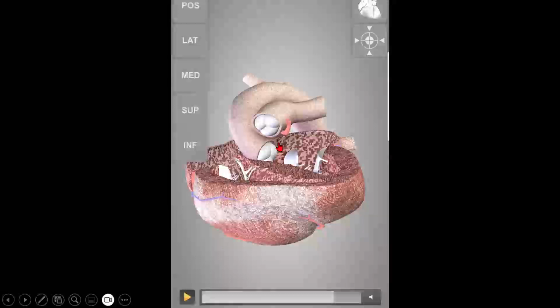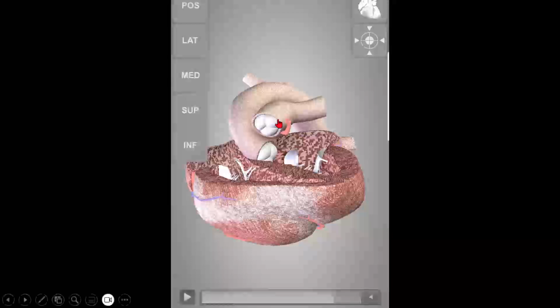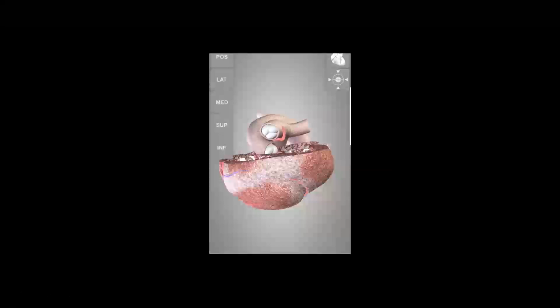So in an apical window, you have the apical 4 chamber view, and the apical 5 chamber view if you sweep the probe anteriorly. And if you sweep the probe more anteriorly, you will stop seeing that aorta, and at right angle to that, you will start seeing this pulmonary artery. That sometimes you call the apical 6 chamber view. So with this animation, you will understand the anterior placement of the aorta from the LV cavity and the anterior, right angle placement of the pulmonary artery to the aorta. That's how the anterior sweep of the probe creates 4 chamber, 5 chamber, and 6 chamber.